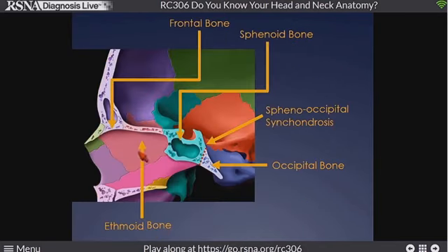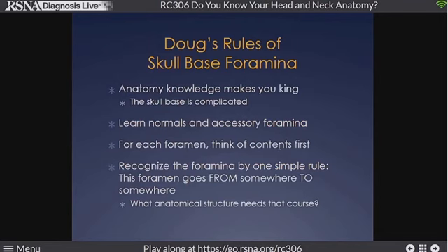So on this sagittal examination, a nice representation of what we actually see: the floor of the anterior fossa, and this interplay between the sinonasal cavity and the CNS spaces. So frontal bone making up a small segment of that, the ethmoid bone behind it, the sphenoid bone, with this nice green coloration here with the sphenoid sinus and the sella, and the occipital bone posteriorly. That spheno-occipital synchondrosis is an important element we look for in development, and again, we're going to see some developmental problems at that area.